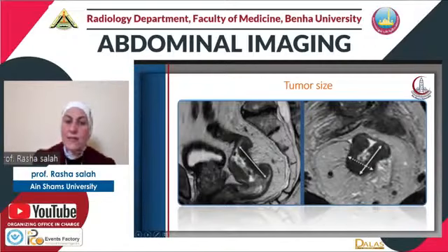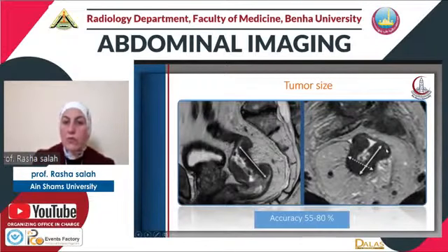Another way to assess the treatment response is by measuring the tumor, but because the rectal wall is flexible and not stable in all sequences, depending on the motility and the distension of the rectal lumen, the accurate measurements of the 3 orthogonal planes of the rectal mass is very difficult. So the tumor size by the conventional 3 orthogonal dimensions is less accurate than other solid tumors.